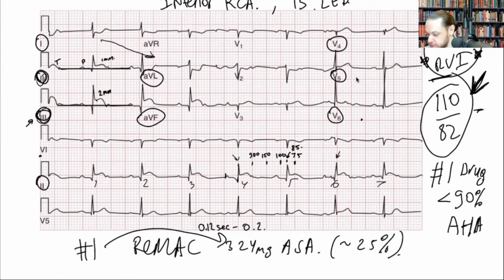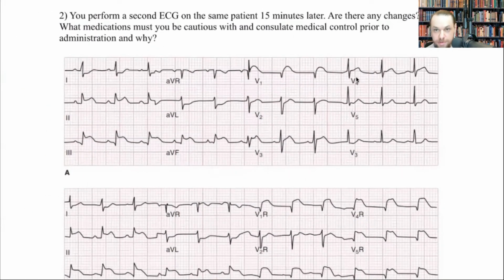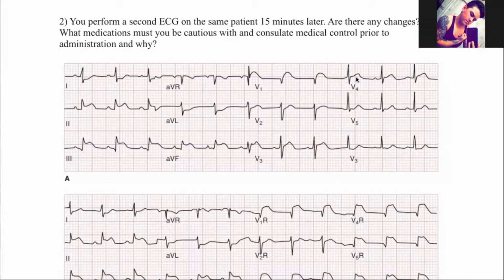All right, next we'll go to the second question. Anyone would like to do it? Can I go? Yeah, go ahead, Jackson. You perform a second ECG on the same patient 15 minutes later. Are there any changes?